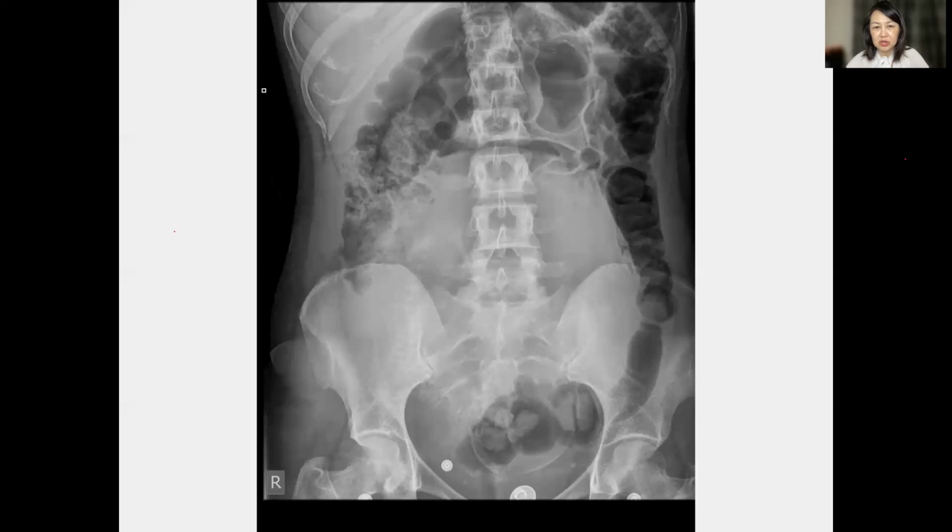Closed loop obstruction. Very interesting. Bowel ischemia. Why do you say bowel ischemia? I will ask this question for you: is bowel ischemia a clinical diagnosis, or can it be diagnosed radiologically? Correlate with the clinical picture, abdomen distension, acute abdomen, plus if there's bowel dilatation, then we might suggest. Is it pneumatosis intestinalis? Not in this case. Next time I will show you the X-ray for pneumatosis intestinalis.